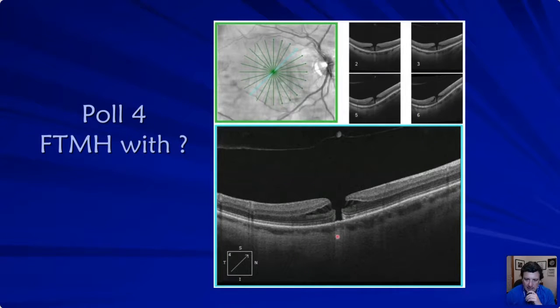You're going to get some hyperreflective light, but remember the RPE absorbs most of that energy, and that hyperreflective column that we see in macular degeneration, what we're seeing here, is a little concern of how long has that been there and what type of acuity will we get back, because the RPE is the life support of those photoreceptors.